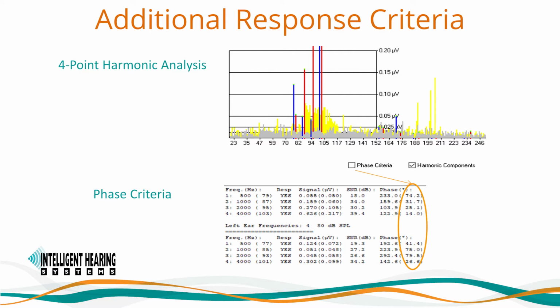It is a good testing strategy to always have the 4-point harmonic analysis activated in the analysis screen, and save this selection as part of your default settings files.